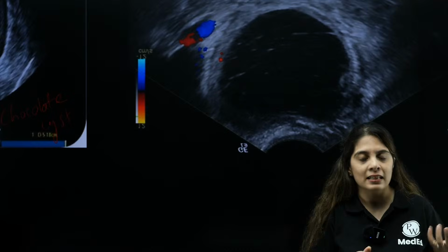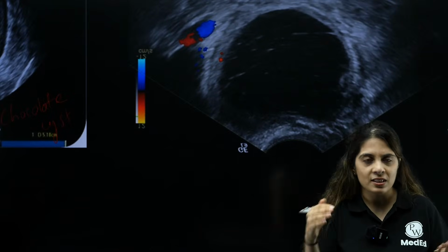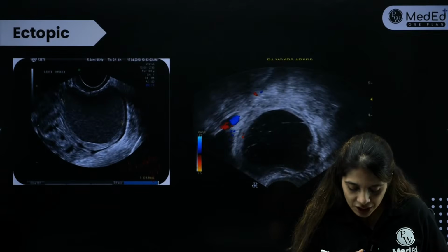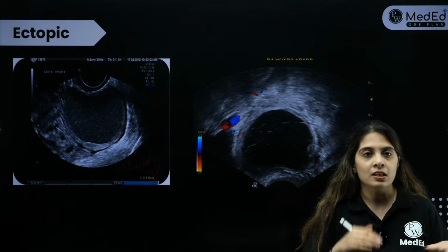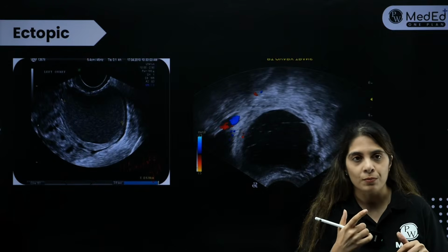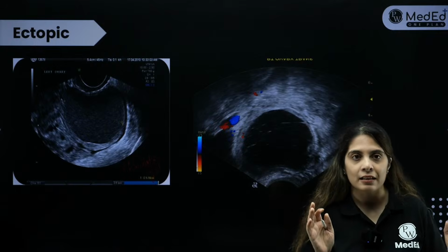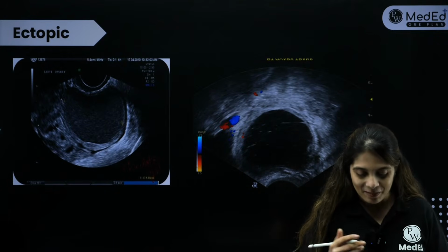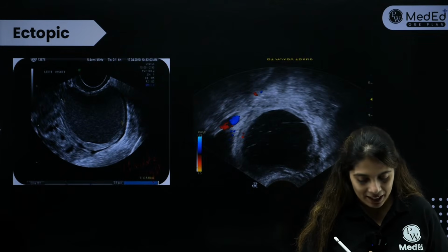It's quite physiological. It's hemorrhage that happens either in a corpus luteal cyst or in a simple follicular cyst. You will get this classical fishnet appearance. Yes, Shiva, it is ground glass appearance. So good, you pointed it out. The first image, the low level chocolate echos, is also sometimes called a ground glass appearance in endometrioma. The second is the fishnet appearance, and that is very characteristically seen for hemorrhagic cyst. Yes, Nizhalini, I'm sorry if I'm not pronouncing it right, but it is hemorrhagic cyst.